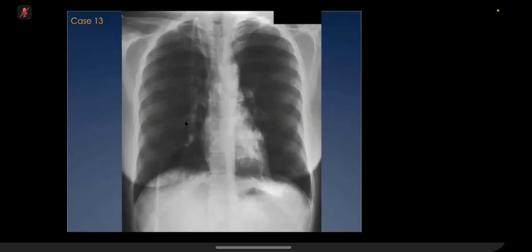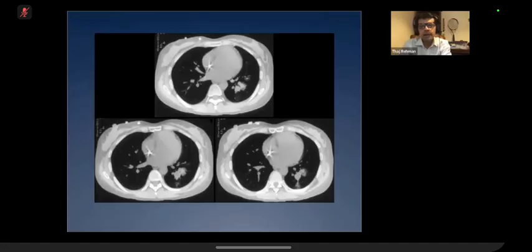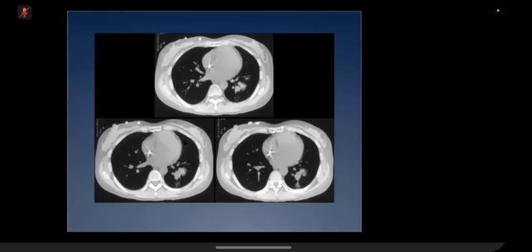In the left side of the lung, behind the heart, there is some. Very good. You're all getting extremely good at picking up retrocardiac hidden area abnormalities. There is consolidation behind the heart in the setting of a probable immunocompromised patient on central line, and I'll give you the CT. Yeah, so the CT is showing reverse halo sign.